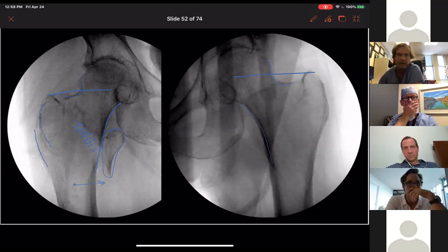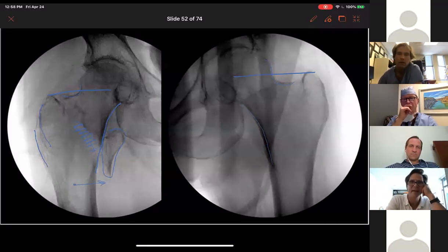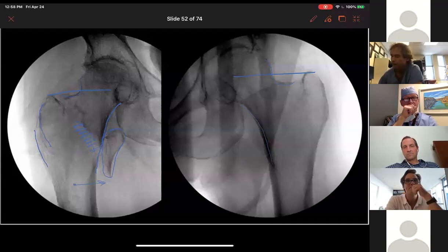So we tried rotation, and it didn't really work very well. So this is when you guys are thinking something lateral on the shaft to medially translate it. Is that fair? Or something over the top to grab the medial neck and pull it laterally, but the same basic concept. Yeah, one or the other. Okay. All right.